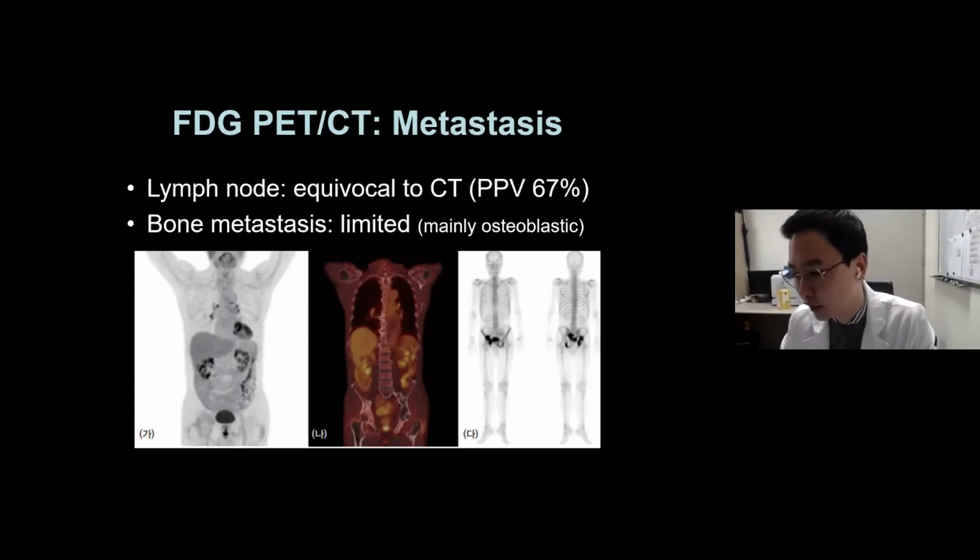But when you see it comprehensively with the corresponding CT, you may find the bone metastasis too. There is also a report that when evaluating treatment response, FDG PET can be more useful compared to the bone scan, since osteoblastic lesions remain although there is a therapeutic response.